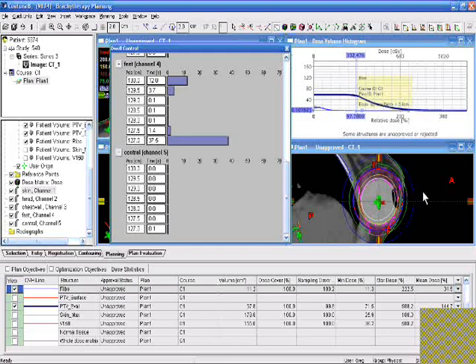And this is not a case where we want to even everything out. So when you're doing the volume optimization, there's no need to eliminate that central channel. I would just leave it in there, let the volume optimization do its work, and modify those parameters as you need to, as we showed here, and this will be the general result. If you need less modulation, you will get some dwell times in here.